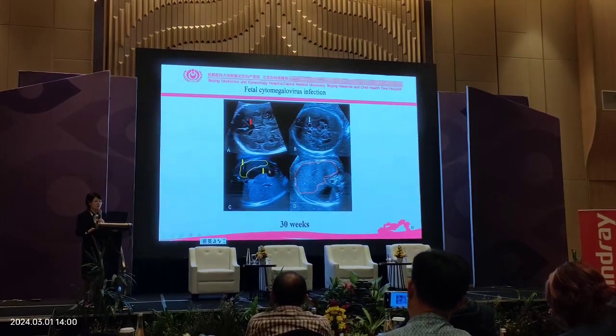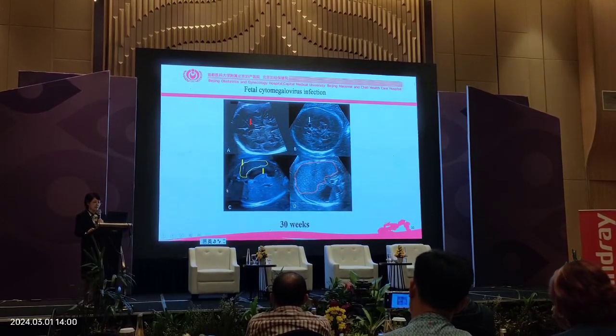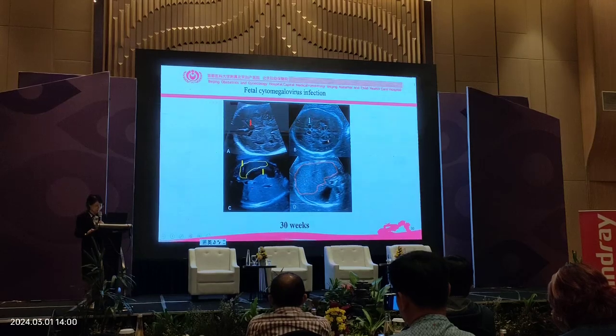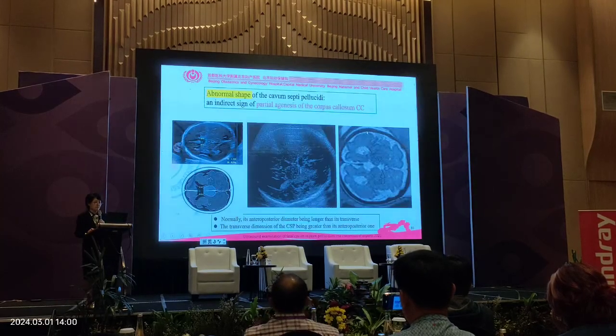This is also for fetal cytomegalovirus infection. Cysts here, and enlargement of the liver and the spleen, and many calcifications, intracranial calcification, and liver and spleen calcification.